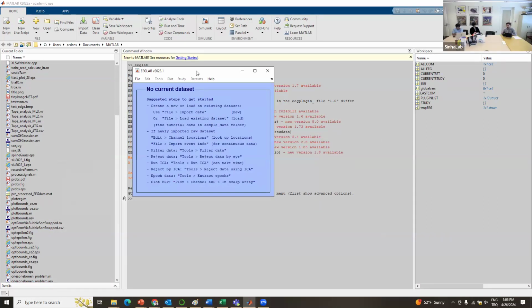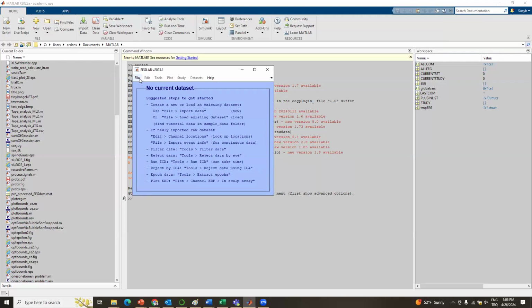Let's do it the following way. This is recorded, so I'm going to show you some pre-processing steps together. We'll do it together, and then you watch the video and try it yourself with the input data that I'll share after the meeting. If you come across something unfamiliar, something you don't understand, or something that shows different results, we can discuss it in our next meeting. Would that be all right? Yeah, sure. Okay, all right.